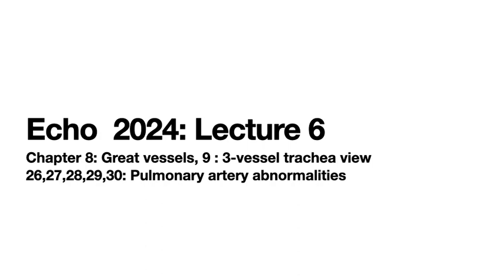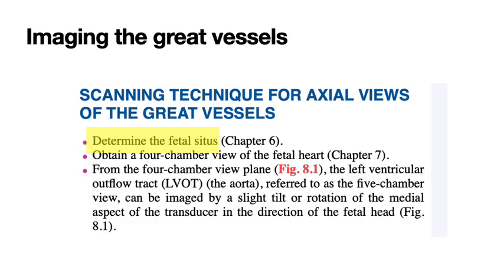And as you'll realize over and over again, all of these kind of overlap. So we're going to hit stuff we hit before, and we'll hit stuff that we haven't hit before and may not be clear, but we'll be getting into later. So we'll get it all done. All right, well, the first thing when you're imaging the great vessels, it all gets back to the same thing, which is step 1, determine the fetal situs.